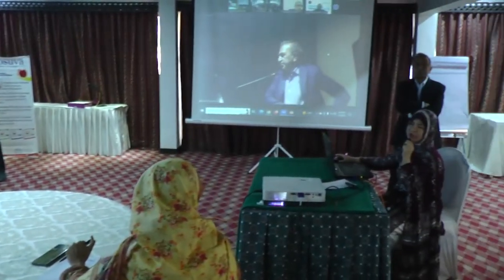But in this case, we cannot achieve the heart rate, because the patient was unstable. No, heart rate it's okay, it's below 100 or 110, and we cannot delay just to wait for the heart rate control and to delay the aortic repair. I know the case of the patient. That's why I mean, yeah, I was saying in general. It was pseudoaneurysm because the neck was narrow as compared to the maximum diameter of the aneurysm. That's why it was a punched out lesion. The entry point was around half of the maximum diameter.